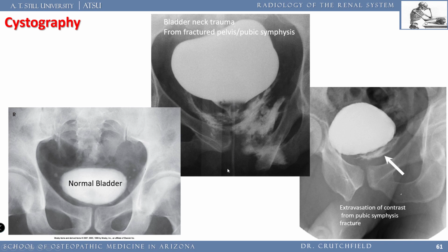So right here's the urethrogram with a cystogram. And here we see contrast leaking out. So he's obviously got a bladder rupture. Same thing over here, we have contrast leaking out. So he's got probably a little tear in his bladder and urine's leaking out. And again, remember, bladder is subperitoneal. That's a good thing in this case, so it's not going to go floating around with his intestines. That urine is going to stay in that subperitoneal space.